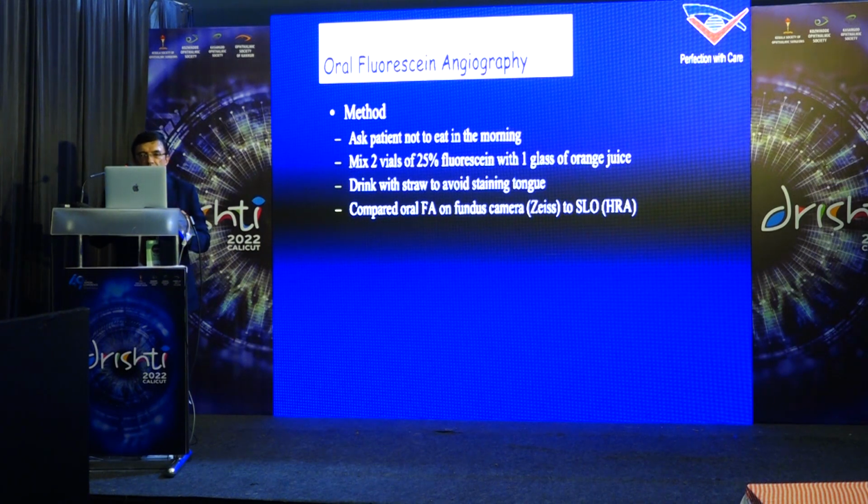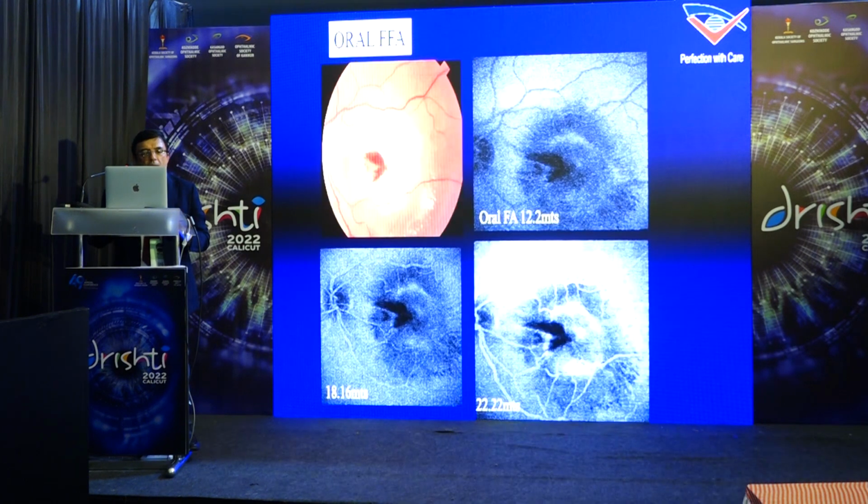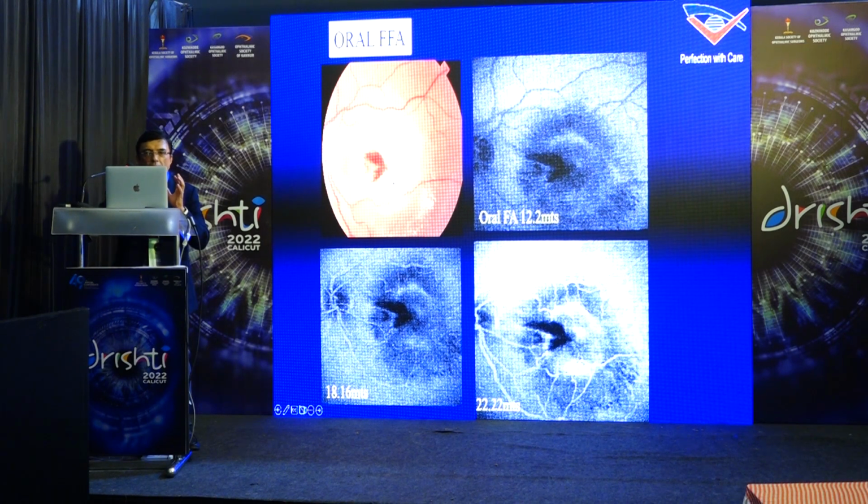Now, another thing which I wish to introduce is a non-invasive way of doing a fluorescein angiography. So this is a documented way of doing an oral fluorescein angiography, especially if you have an SLO-based image. So we had done a study many, many years back where this is an oral FFA, and the same patient we imaged on an IV FFA.